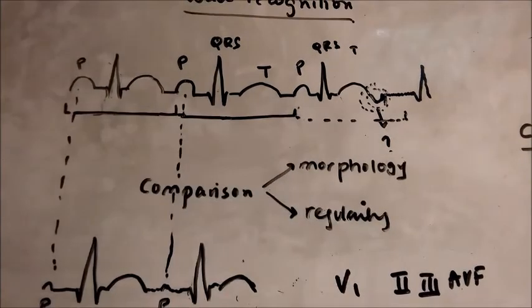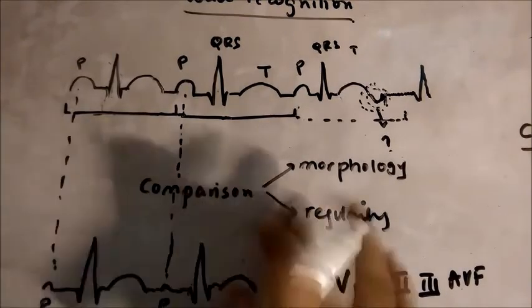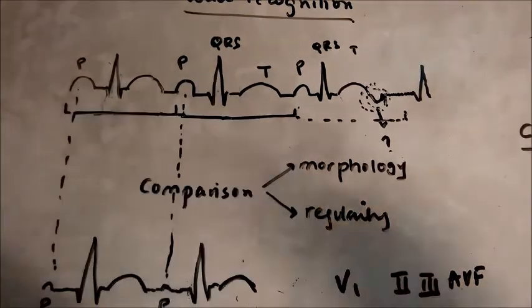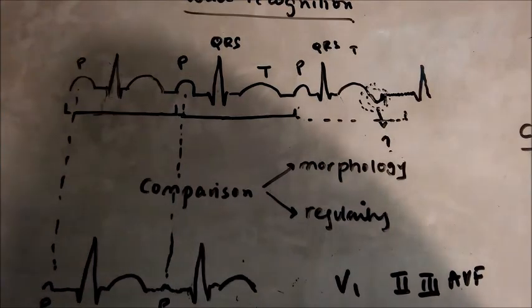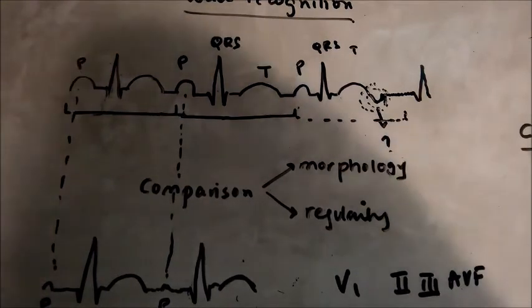Now we discussed comparison. Comparison is very important if you want to recognize a wave. For wave recognition, you need to compare the waves. You need to compare the waves in one lead, and you need to compare the waves between different leads.